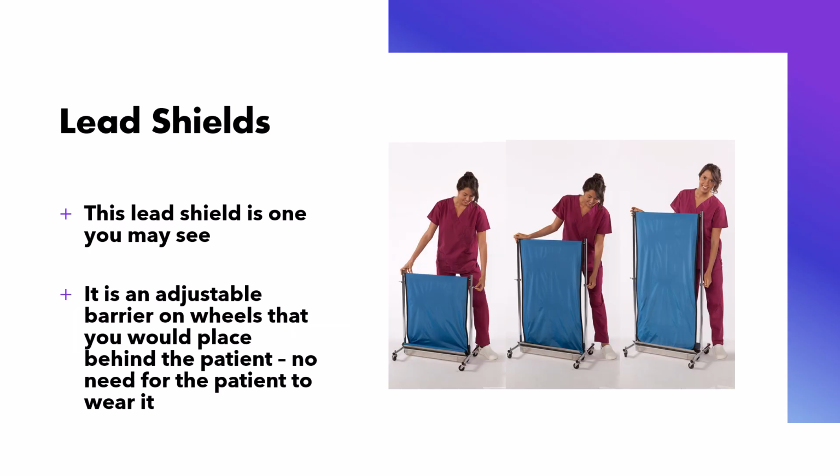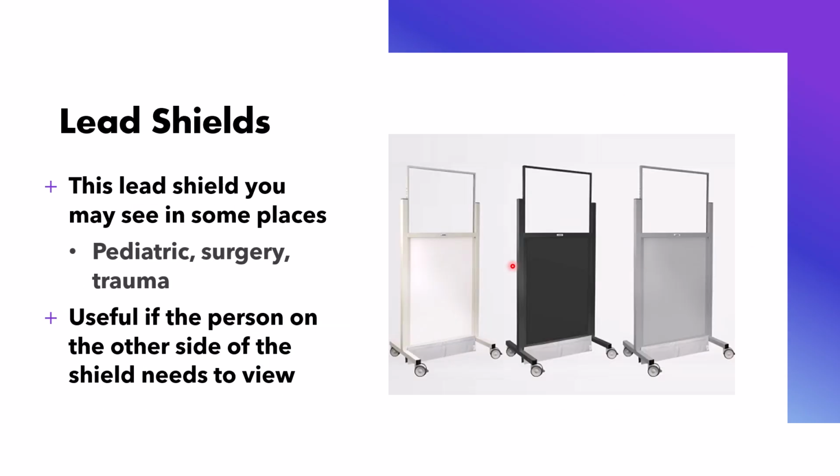Mobile lead shields that you can move around instead of putting it on the patient. And this is a lead barrier that we would stand behind. If you don't have a booth that you can stand in, this is a leaded glass and a lead shield that you can stand behind if you have to be in the room with the patient. You see these in the trauma center a good bit.